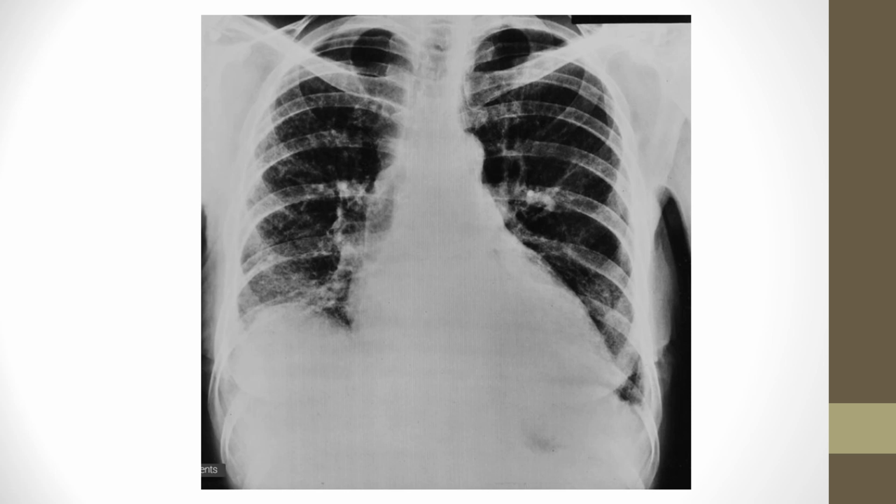So a small pleural effusion in this picture has developed, and you can see on the right side that the CP angle is blunted. You don't see a good sharp CP angle, and it's obscuring that right diaphragm a little bit. Do you see this situation? That's called the blunted CP angle. So is this greater than 20% if you just see a little bit of obscuring, but not to the point where it's a complete white out? This is something that they may just let reabsorb on its own.